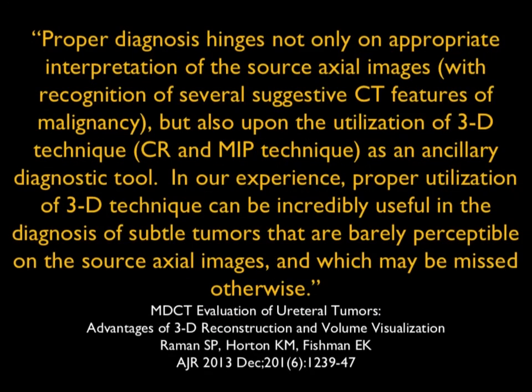And the article by Rahman goes on to say the proper diagnosis hinges not only on the appropriate interpretation of the source images, but on using 3D techniques as an ancillary tool. In our experience, utilization of 3D technique can be used in the diagnosis of subtle tumors that are barely perceptible even on source images, but can be missed.